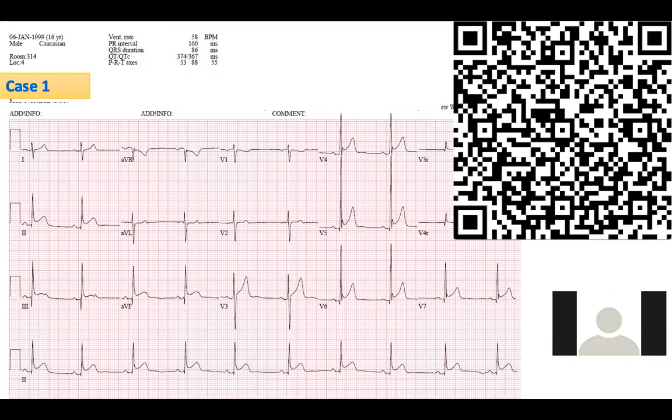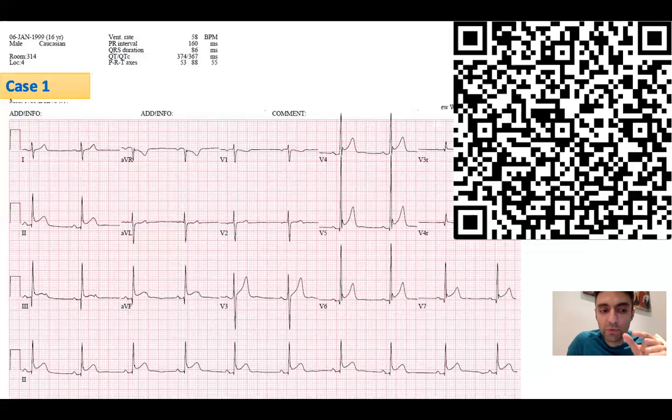Deep, somewhat large. Usually less than 7 is fine, but only one lead may be insignificant. The depth is not as important as the width; the wide Q wave is more relevant than its height or depth. Less than 7, sometimes people say 8 small squares, could be fine.